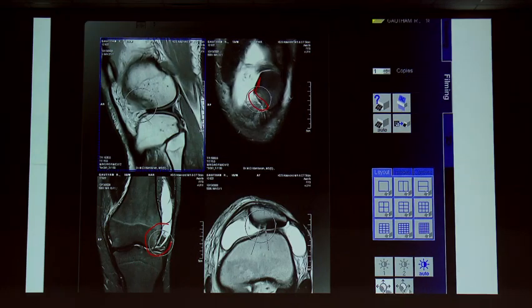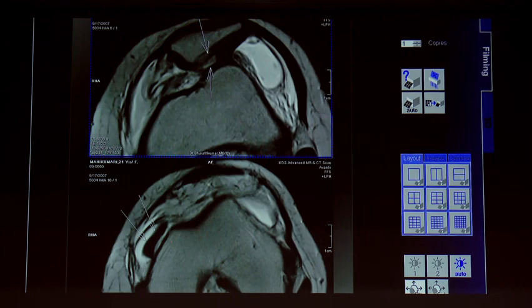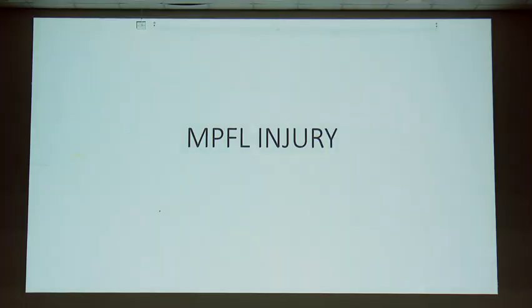The osteochondral injury. Whenever there is an osteochondral injury, the impact will be there. So you can see the fragment from here, it has gone and denuded, there is a loose body here. Because whenever they are doing arthroscopic surgery, they can get it and they can go for the same autologous reimplant. That is very important. For that purpose, we have to be very careful. Where is that loose body?